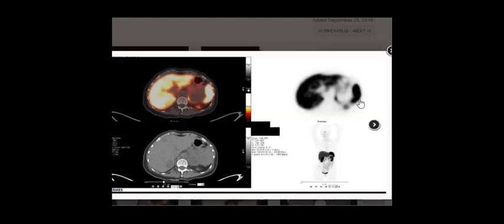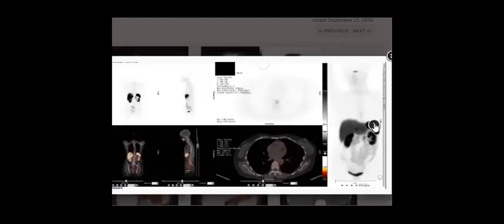And regarding the spleen, if it is diffuse uptake, maybe abnormal. Do you find anything abnormal here in this image before we shift? So at least there is a chest wall lesion, and until now there is a bilateral suprarenal lesion.